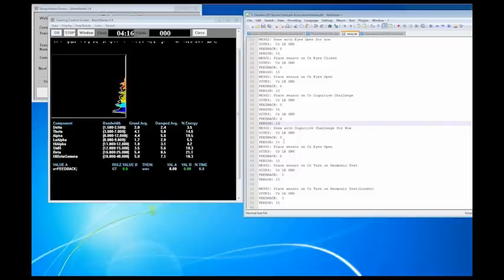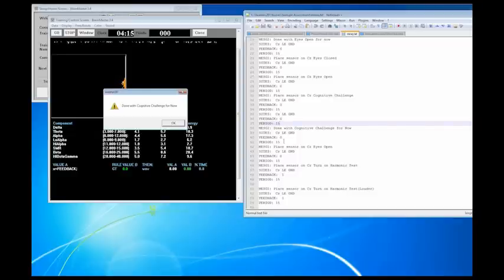Actually, Dr. Venter, I believe I did create, and I'm going to just leave this paused for right now because Dr. Venter asked a very good question. Can you show us how to change the Swingle assessment for use with the Discovery without having to move the electrode? It already is. That's the nice thing about the Discovery versus the Atlantis. Because it's an acquisition and then training system, it's already set up to acquire all 5 sites. The only thing you have to do is hit OK through all the different messages because it's still collecting the data each individually like that.